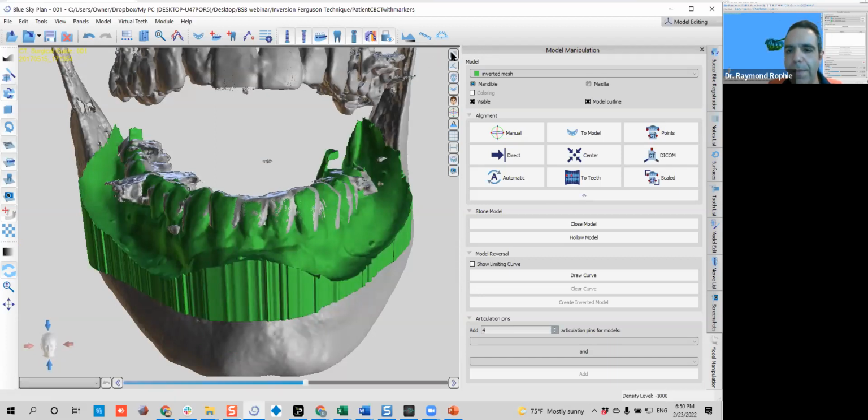Okay, so I'm gonna grab the 3D model view and I will make it large. I will enlarge, maximize it. And what I will do at this point in time is I want my CBCT out. Okay, how do I remove my CBCT from this window?